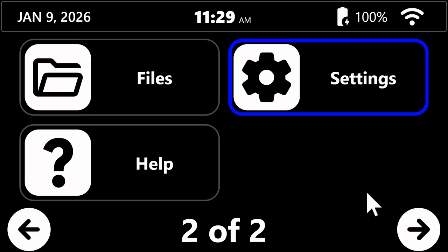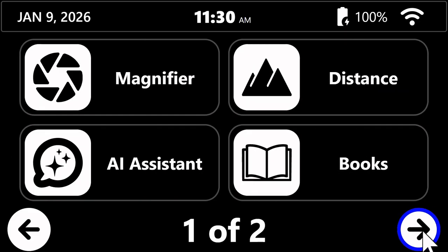So notice here that you can see that our interface now has actually 3 icons here where it had 2 a moment ago. Remember, we turned on all of the applications in our carousel. They're also not showing in full color here. We have converted them to that white on black contrast. So it's always throughout the interface now. In the bottom right, I'll tap my arrow, and now I see the other 4 icons. Again, all 7 available applications are now showing in the interface.